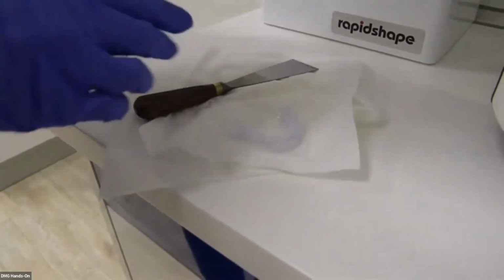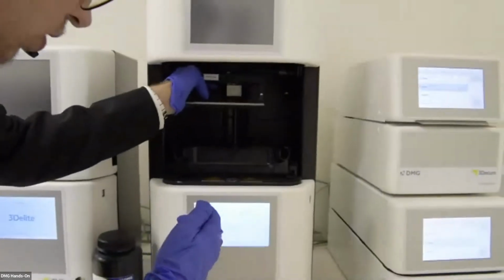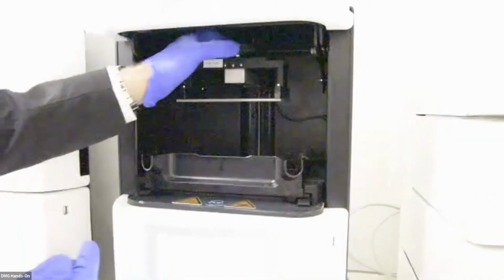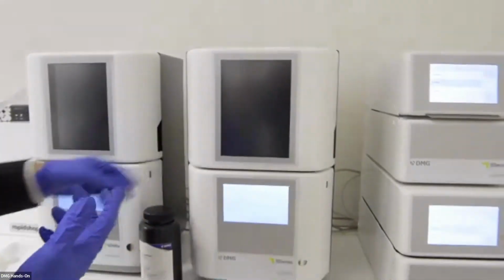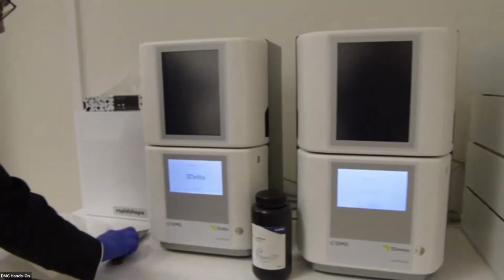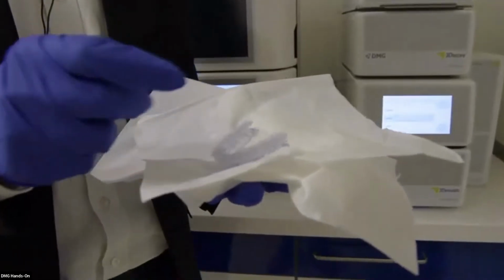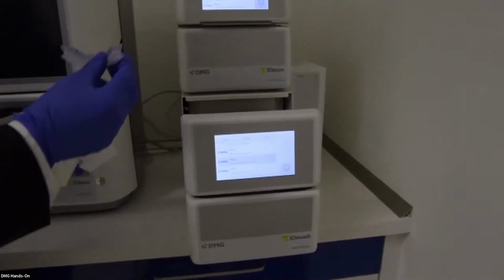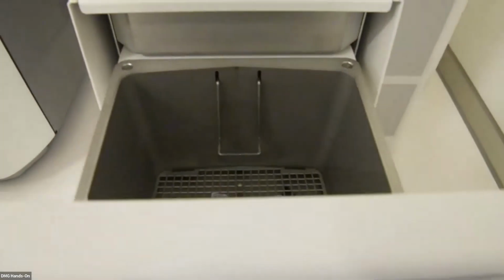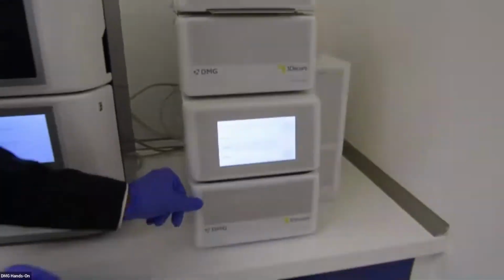That's it. I will put this back into the printer so we can start the next printing job as soon as it is sliced. Tighten the screw and close it because it's a light sensitive material. And now we will take this splint with the supports and put it inside our 3D wash, which is a fully automatic cleaning unit. I put it in, and I will have a short video to show you how it works inside, because it gets locked as soon as I start the process.